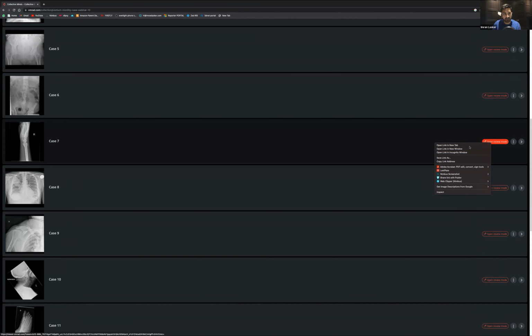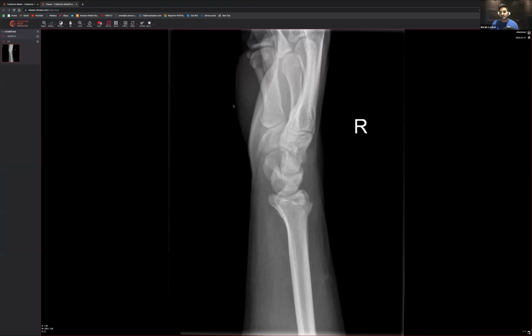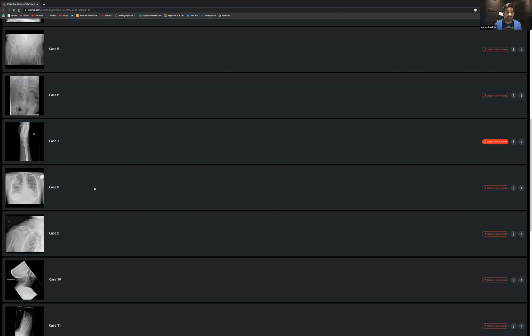So let's have a look at case number 7. This looks like it is a lateral view. Can you repeat, if the air went all the way to the liver edge, what should you think of? Okay, so if the air goes all the way to the edge, I just want to go back to that previous case, that's a really important thing.